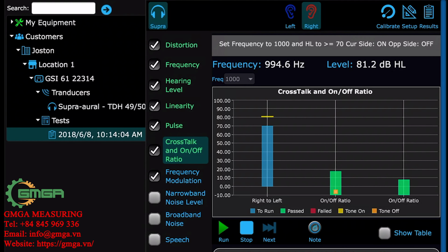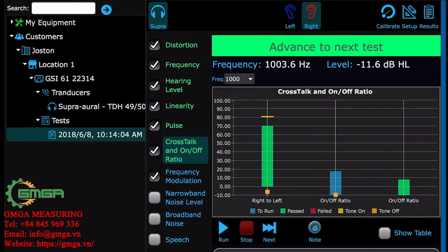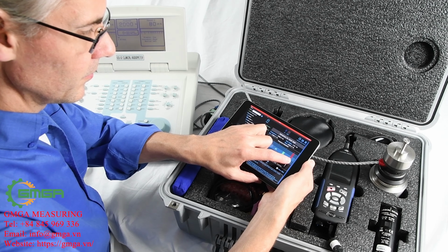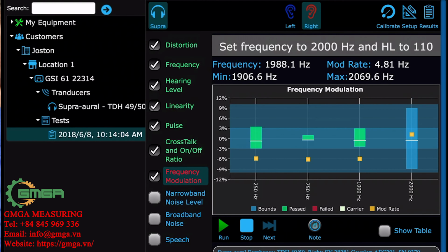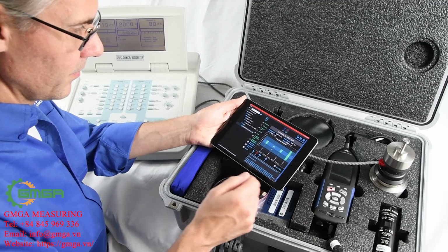Press Run, follow the prompt, press OK, and you can choose to stop the test here or run the other 2 steps again. You don't need to retake a whole test if only one step fails. In a stopped state, do a long tap on that step to redo it. If it's not the last step that you were redoing, press Stop when you're done.